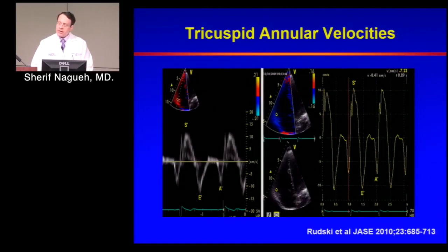So now you are looking at two vectors summing up and giving you a higher velocity. So when you are looking at your data and you're adding them together, things have to flow. Example, you see a big ventricle, a fractional area change that is, say, 20%, and you have what looks like a normal velocity. Just because you see a normal velocity here, do not release the report as a normal RV function.